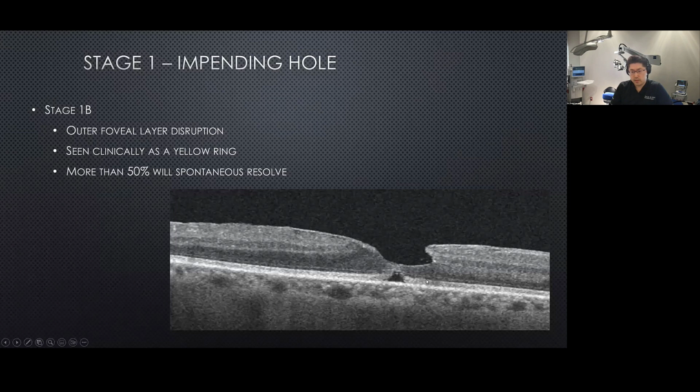Now, in this case, this outer retinal disturbance also has a name. And of course, there are many names, many signs. Some are actually useful. This is called subfoveal translucency. Essentially, what it means is that there's an outer retinal defect. Sometimes, even after the repair of retinal detachment, vitreomacular traction, or macular hole, you can still get this subfoveal translucency effect that with time may recover. So there we go.